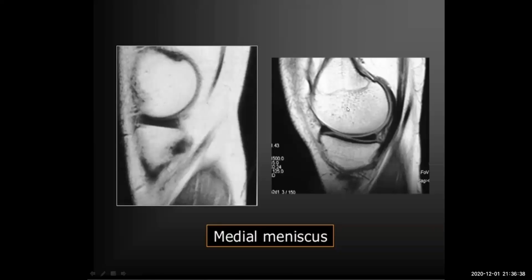So this is the medial femoral condyle, and if you have pathology here, you can say confidently it is in this compartment. For example, an osteochondral defect is by far the commoner, or a fracture like a Hoffa fracture in the medial femoral condyle. Okay?